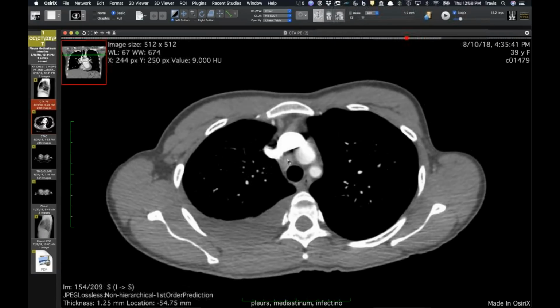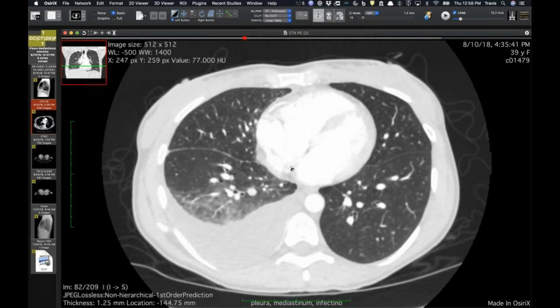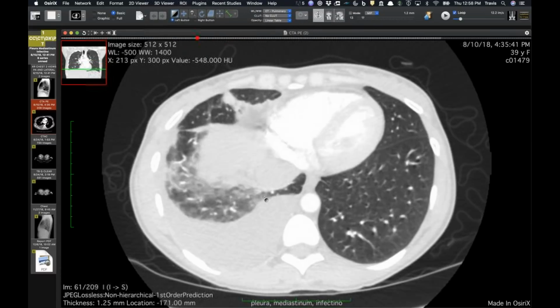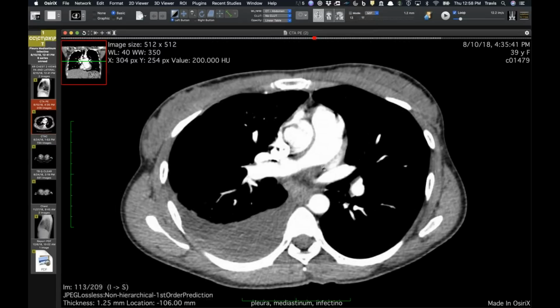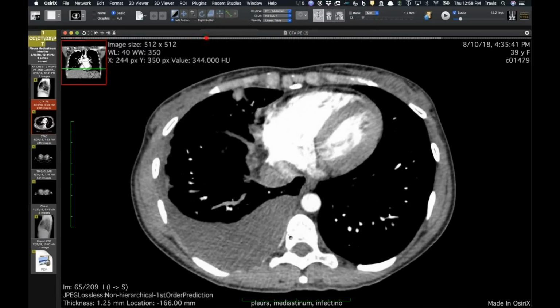She has a few mildly enlarged lymph nodes here in the mediastinum. And when you look, I was actually worried because I thought there was maybe a little bit of nodularity developing in the fissure on this study. And of course, this is a PE study, so we don't get a great look at the enhancement of the pleura just because we're timing this early.